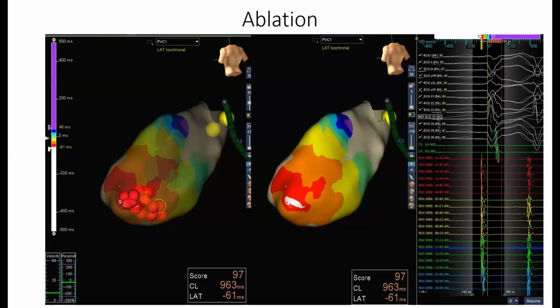Keep going. So you ablated a pretty wide area, but you don't know where you ablated. It looks like you ablated a papillary muscle, because your papillary muscle looks like it is above where your ablation site was, it seems to me. Because of that depression that you see above the red spot, I think that's a papillary muscle. I'm guessing right now. So that's why you have that tip indentation in the endocardial map.